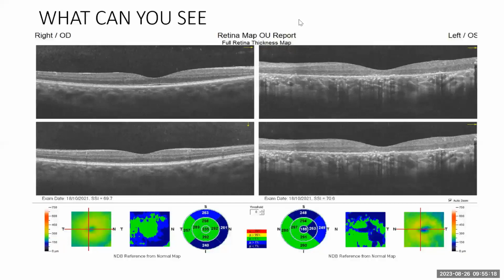Yes. And there are some small corrugations or distortions I can see in the outer retina in that left eye, and then the medium vessels seem dilated in the choroid, with some shadowing. Okay. Thank you, sir.